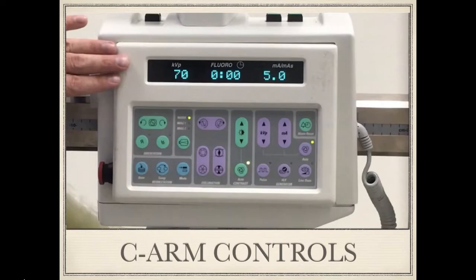The next section we have got is over here. The machine always defaults to this mode, which is the auto contrast mode. If you press this button again, you can adjust the contrast and the brightness by using these two arrows or these two buttons. The next section is to do with the controls of the KV and the MA.